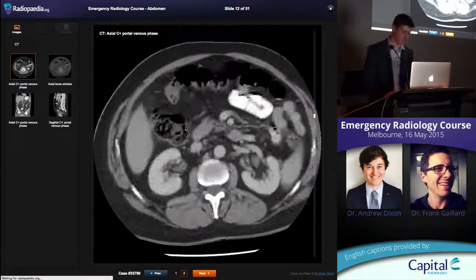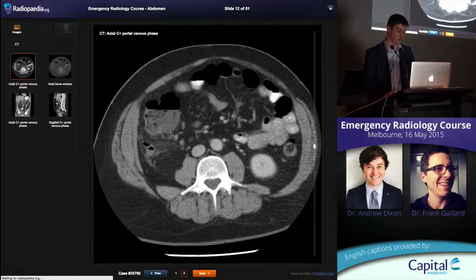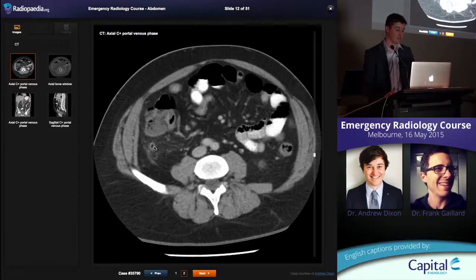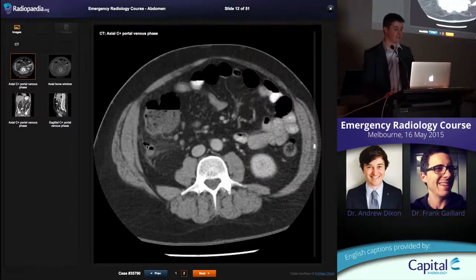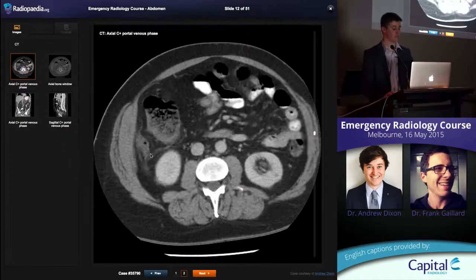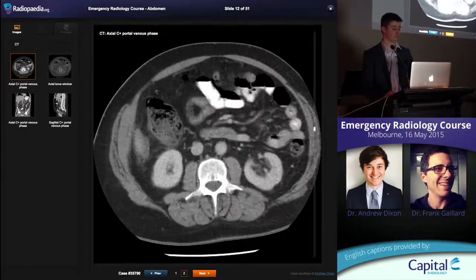Final appendicitis case, patient here who has, so finding the small bowel coming in, that's the ileocecal junction there, looking a few centimetres down, you can see the origin of the appendix, a little bit of stranding in the fat around it. See that little bit of fluid, streakiness in the fat, a little bit of gas, which doesn't seem to be in the lumen, right? Here's the lumen of the appendix, locules of gas next to it. You track it up, here's another little bit of fluid sitting right next to the tip of the liver with locules of gas in it.